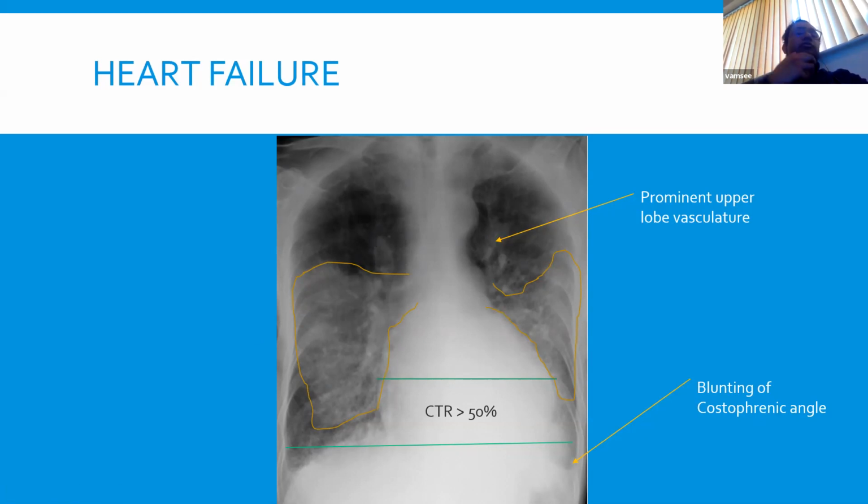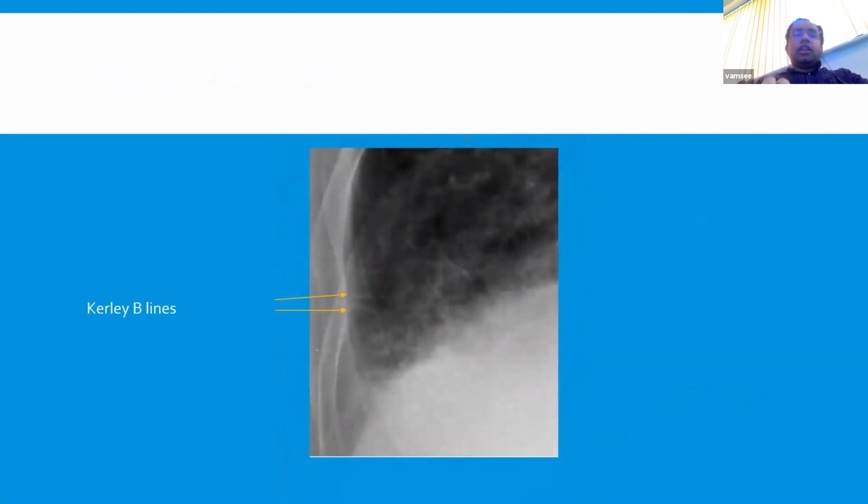They literally are. There's fluid leaking out into their air spaces because the heart just isn't able to pump, or we've given them too much fluid in this case. So yeah, this is your classic picture with heart failure. And it's again another favorite of the examiners. Now, I've just tried to highlight this here.